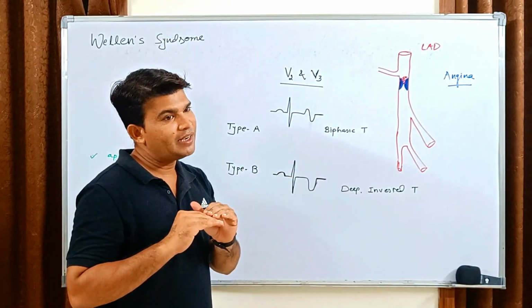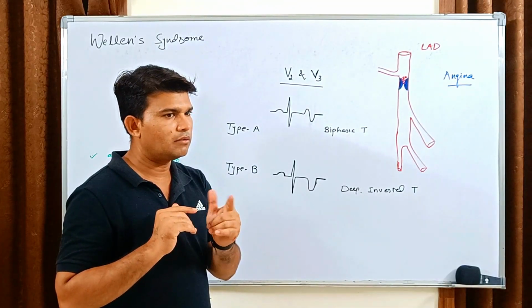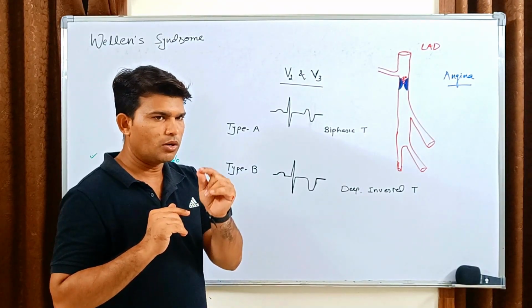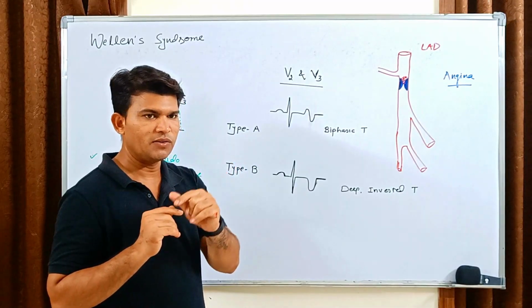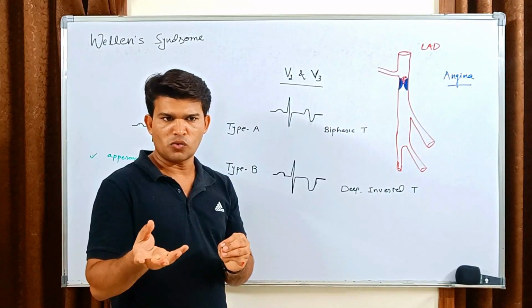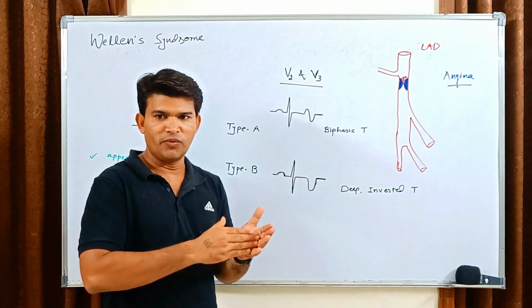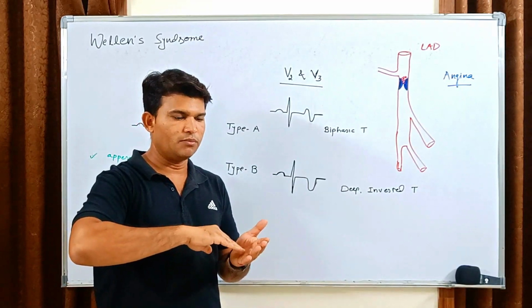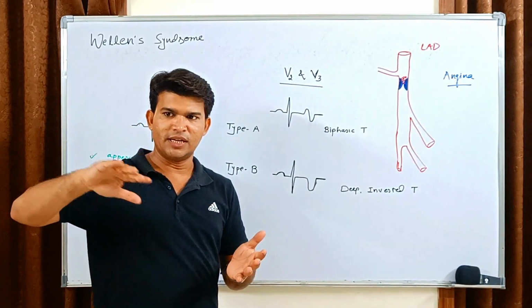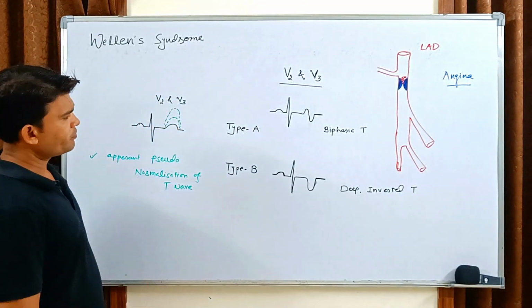The ST segment may be normal or slightly elevated, less than 1 mm. You may have a normal or elevated biomarker, that is troponin. You may have a normal R wave progression from V1 to V5, V6. You see progressively the R wave is increasing in voltage, that is normal R wave progression, right?